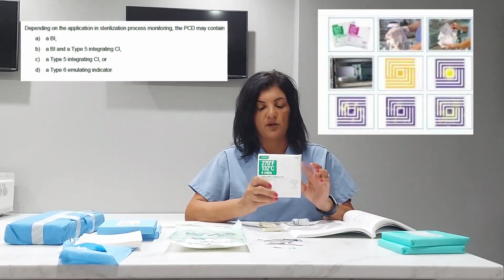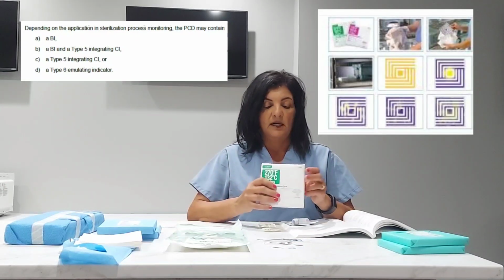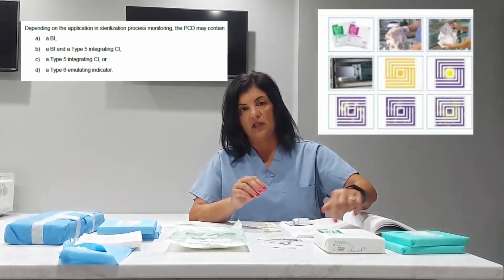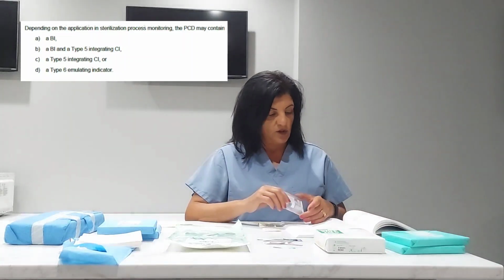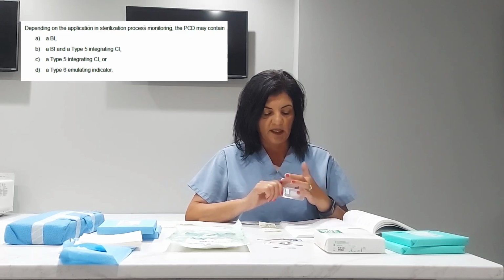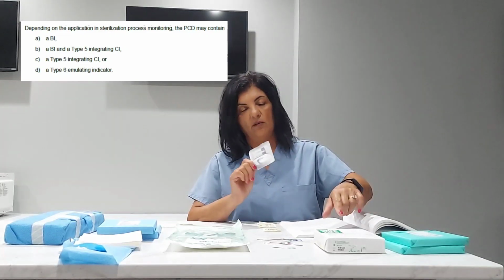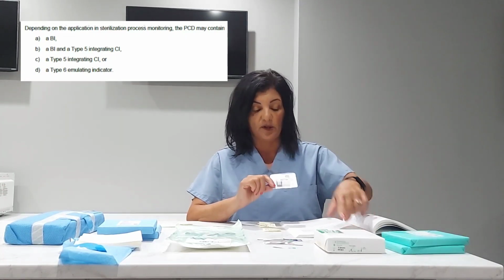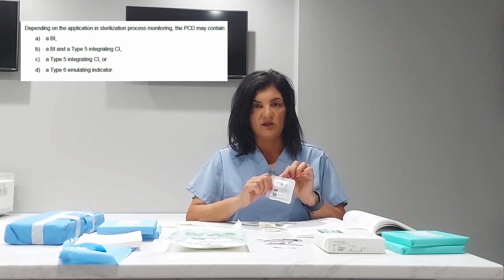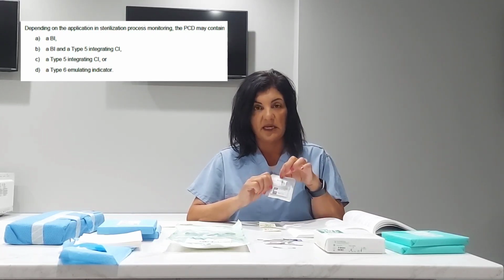Again, I'll put a picture up of what this looks like, sterile and unsterile. It kind of looks like your Bowie. It's got the cards in it and so on, and the sheet that changes from yellow to black. And this particular item, this plastic is considered the challenge, so it's more environmentally friendly without all the papers. There's a tiny little, I call it a straw, that's where the steam gets in, and this is what causes the challenge because the steam has to go in this tiny little hole.